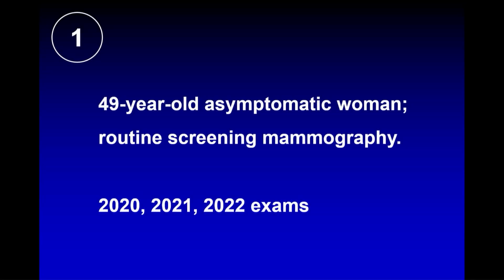Well, before we get started, I'd like to reinforce the concept that what we're looking at now are slides of the cases that I hope you did preview on the workstations. If you did, you'll know that a lot of them have very subtle findings. And to see subtle findings, you need to be as close to the screen as possible. If you're sitting too far back, I'm going to be talking about things you will not be able to see.